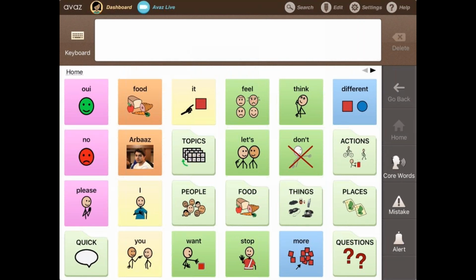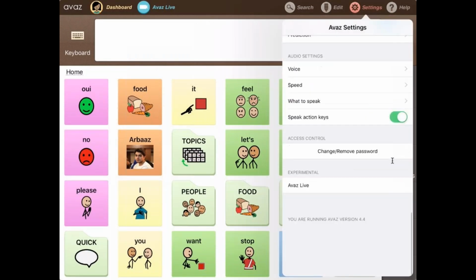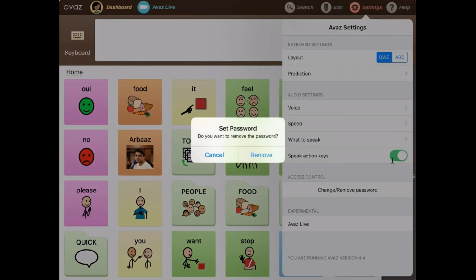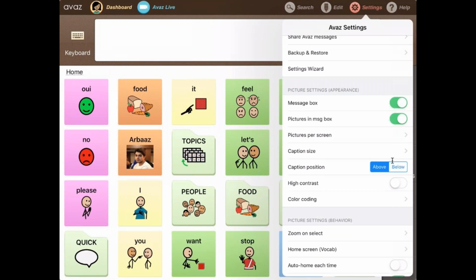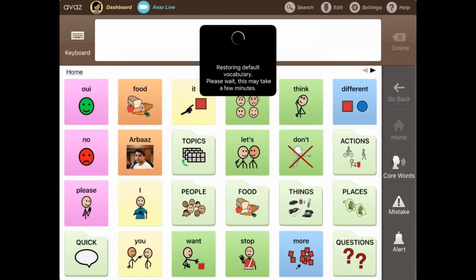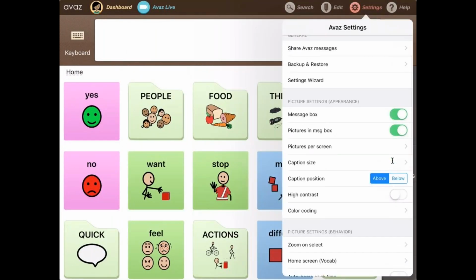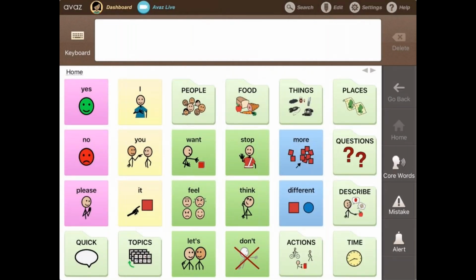So we have another question from Wendy. Could you please show the options to add frequently used sentences again? Thank you. I would love to do that. Before, let me just remove the password. And okay, for easier understanding, since some of you joined later in the demo, now I will basically be showing how you can add frequently used sentences again.